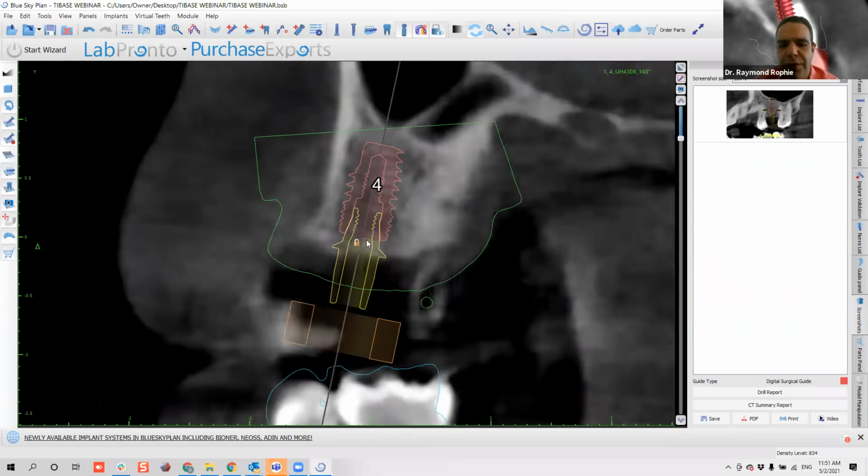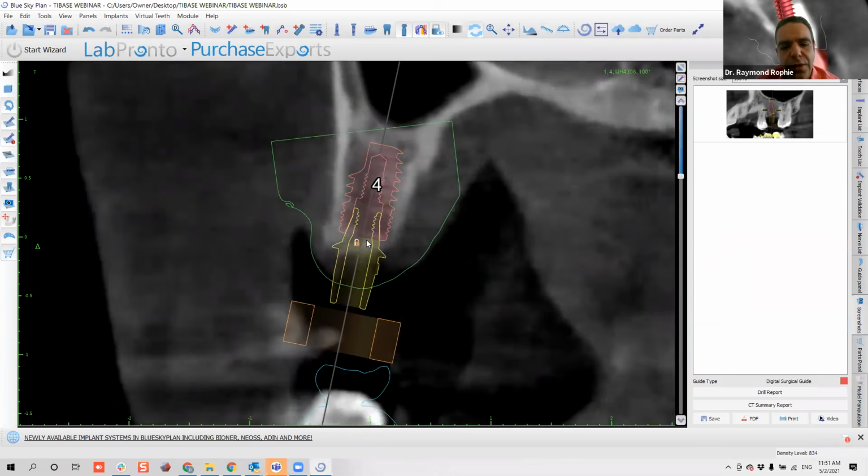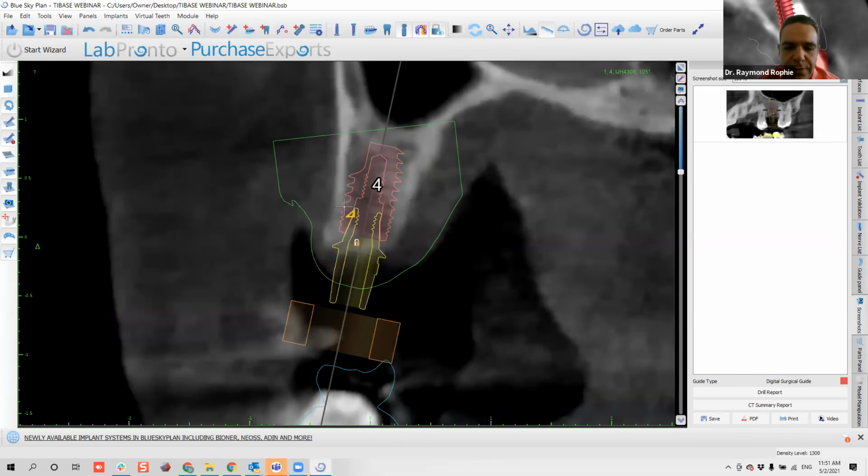I change the perspective so I can see the buccolingual. And I will grab the ruler again and check all my measurements. Here, for example, you have to know something. In the bicortical area, we know that this area is part of the active design of the implant, right? However, it's not what the osteotomy will look like, following the body of your implant. So you can make all these measurements, but you have to take that into consideration every time, okay?